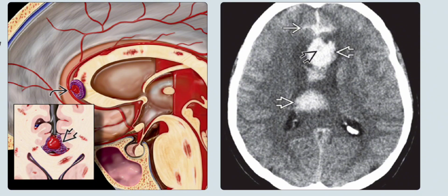Right is the axial non-enhanced CT scan in a 52-year-old woman with sudden onset of severe headache 2 weeks following the closed head injury, and it shows the subarachnoid hemorrhage and focal hematomas within the corpus callosum. A subtle focus of relative hypodensity is present within the genu clot.